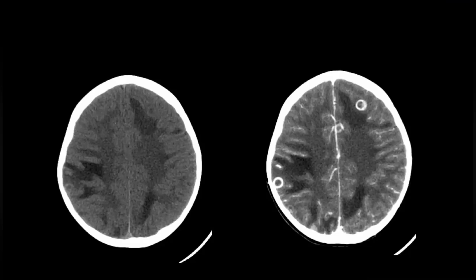Yeah, so what is your differential for these ring enhancing lesions? As these are multiple ring enhancing lesions, I'm thinking of infective focus like tuberculosis. Others: multiple ring enhancing lesions also indicate the presence of cystic metastatic disease. Other differentials will include the active phase of neurocysticercosis. And some granulomatous lesions like fungal infections also present as ring-enhancing lesions. Yes. So that's good. Your differential is excellent.